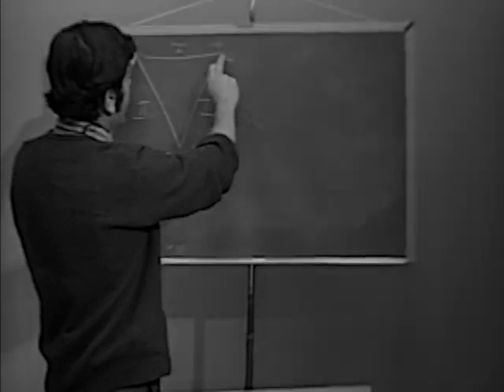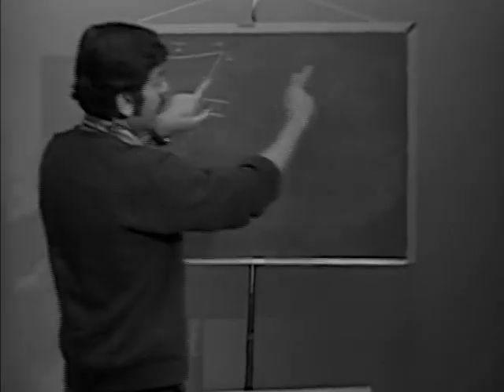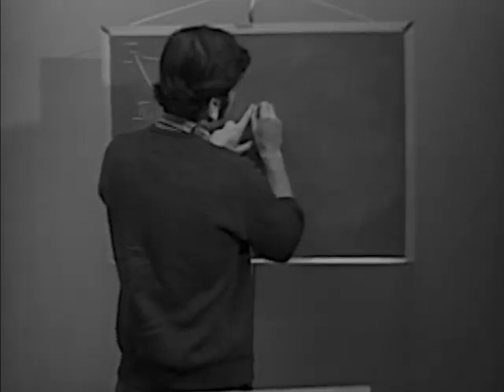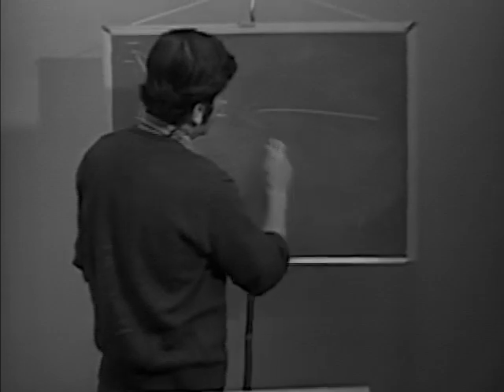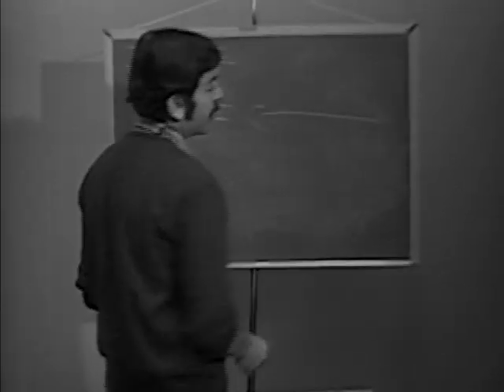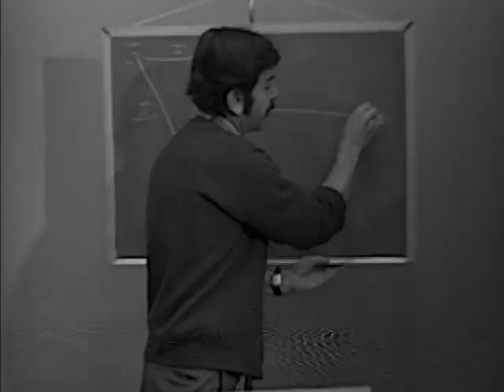Okay, now what we're going to do is we take out lead 1 and just put it here. This is lead 1, negative to positive. And if we have negative to positive, we'll just draw an arrow at the positive end, right?